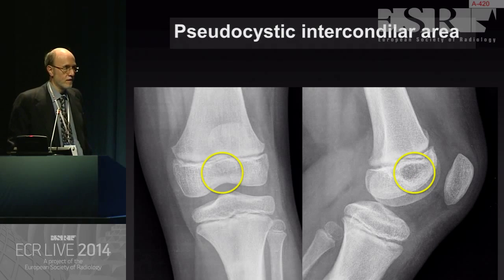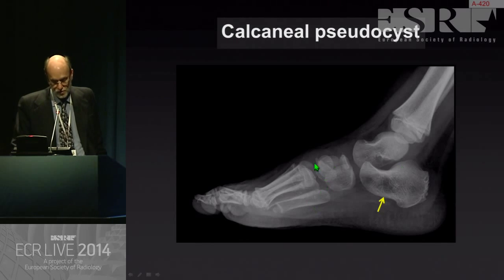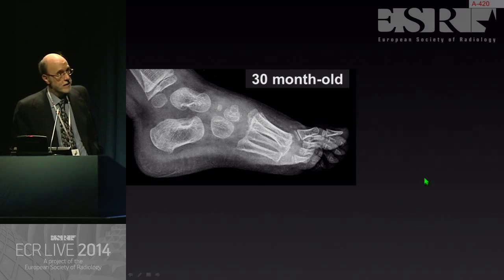So it's not uncommon for people not accustomed to these pseudo-lesions to ask if there is any pathology or not. Of course, one of the most common locations for this arrangement of the trabecula is the calcaneum. Another case of this arrangement.